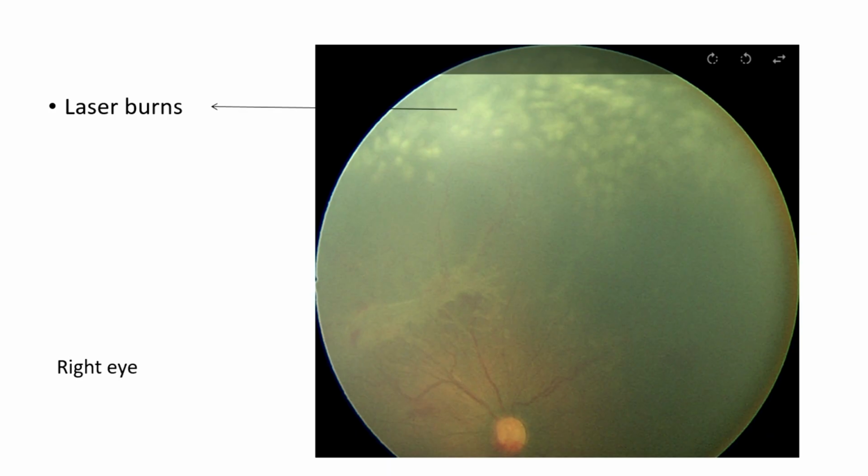All right. Anjali, if you have seen so much of regression patterns now, what are these lesions? These tiny lesions there. Not this. This we know is extraretinal proliferation, which signifies stage 3. What is this? So these white fibrous islands you're saying.